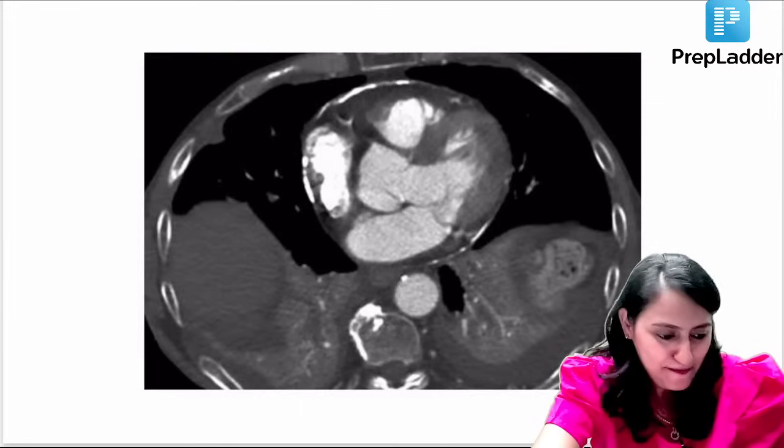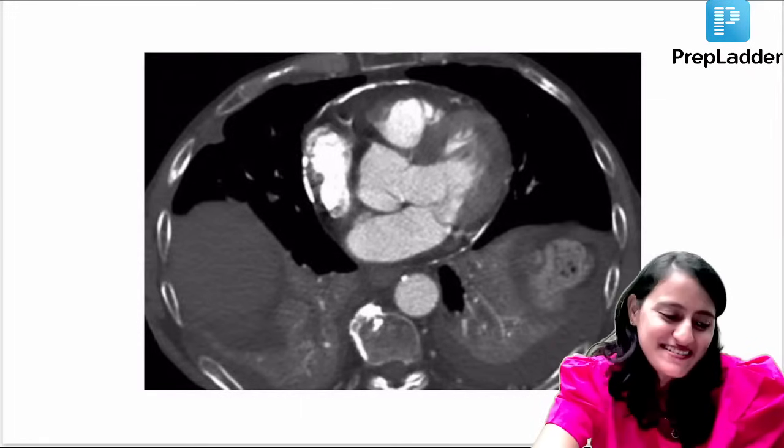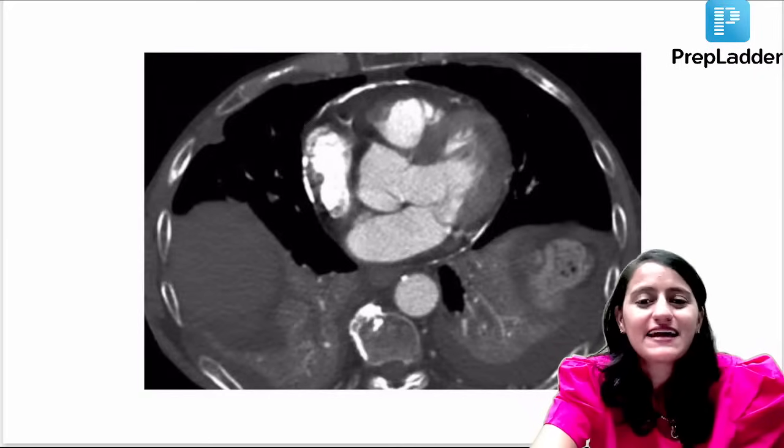Very good. Is it a mediastinal mass? No. You guys are right. There is calcification. Where is the calcification? Great. At least you can pick up ki kuch toh calcification hai. Kahan pe hai calcification? Ab woh dekho. Where is the calcification?